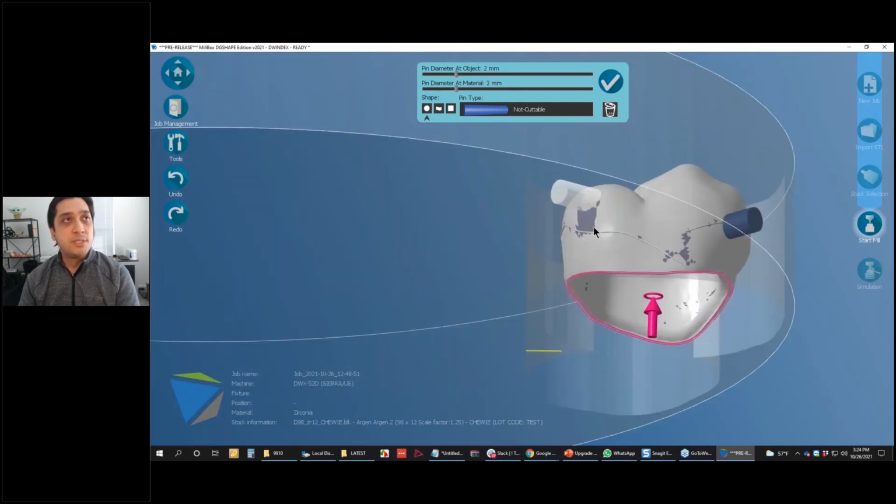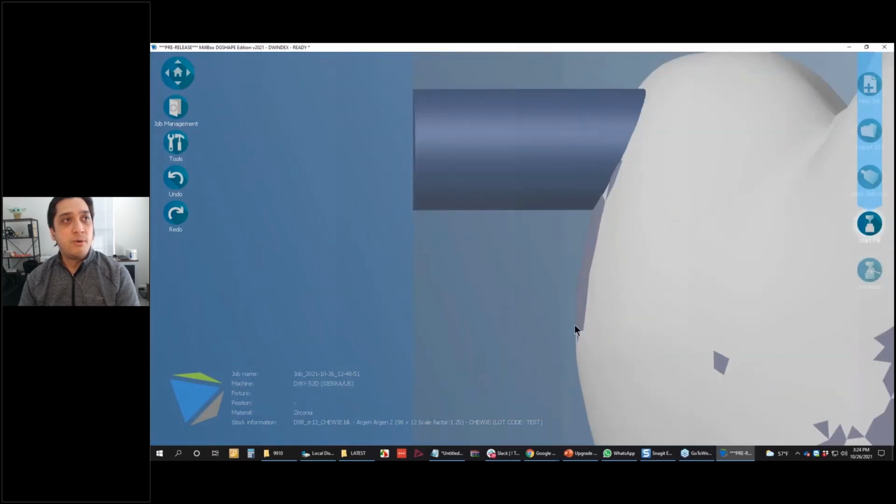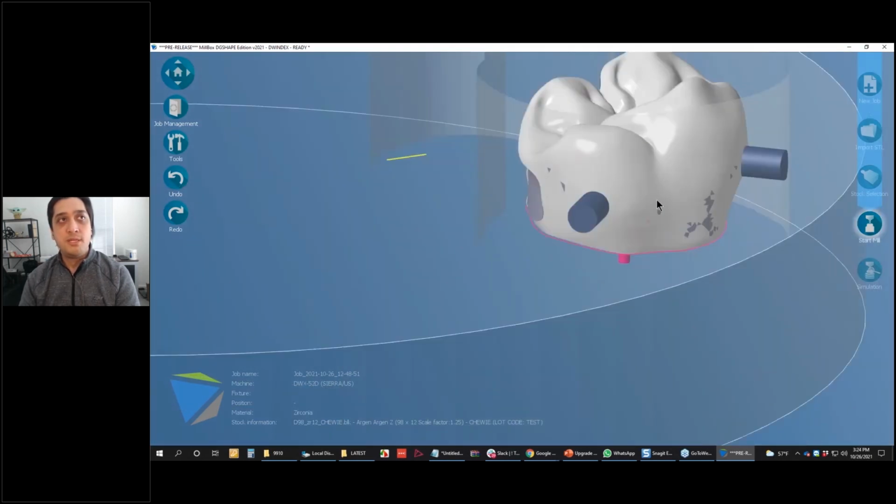If I were to do something like this and I did not mill the undercuts, what will essentially happen is, from the bottom of this shadow up to the support pin, you'll just see a solid strip of material where the tool didn't negotiate around that height of contour to come in and mill these blue shaded areas. So, food for thought there when you're placing your support pins.